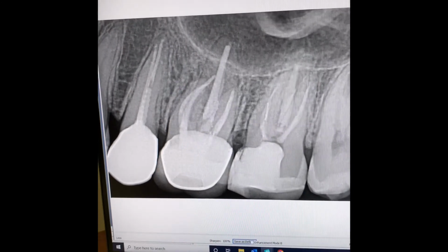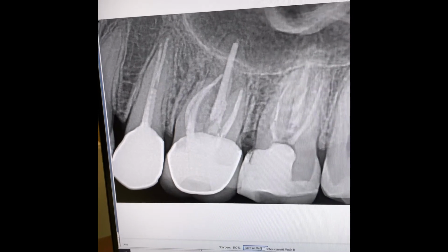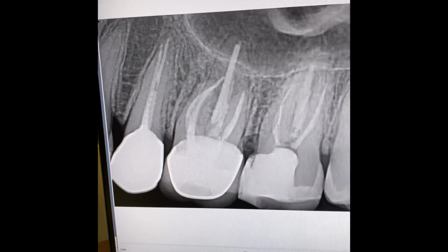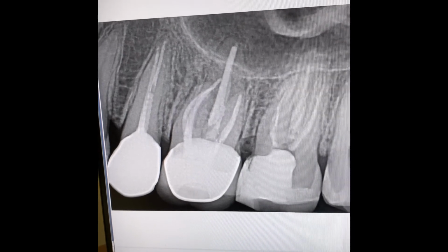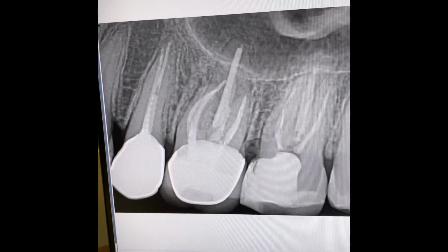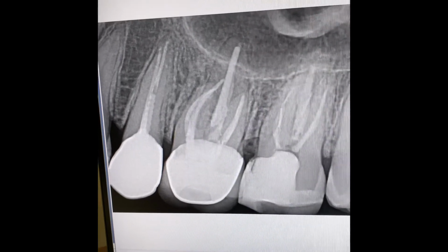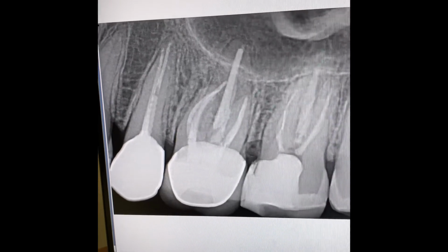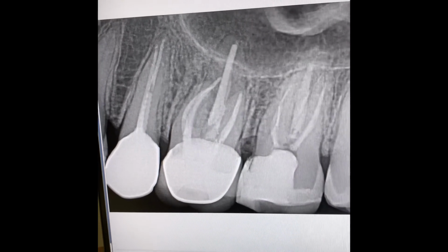Okay, and here is the 6 months post-op. So you remember this case, and the patient came to see me. It's been 6 months. She has 0 symptoms. All her symptoms have gone away after we redid the root canal. So you remember, it was done in Azerbaijan originally, then an endodontist in the San Francisco Bay Area redid it. After taking multiple CBCTs, they told the patient there was a missed MB2, located it, and the patient still had symptoms.